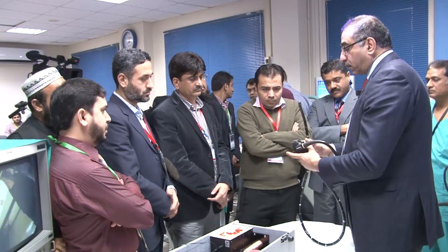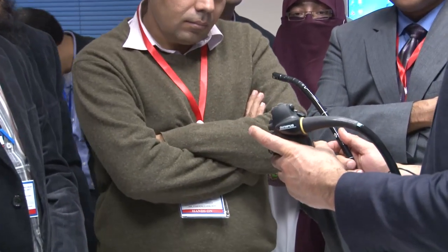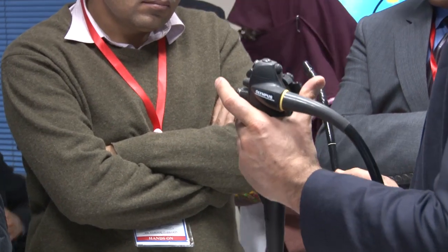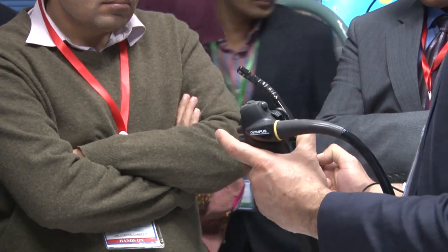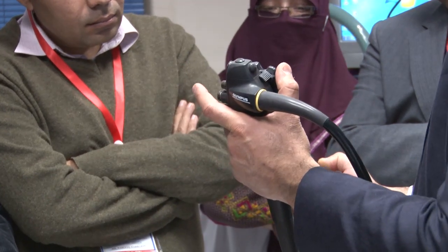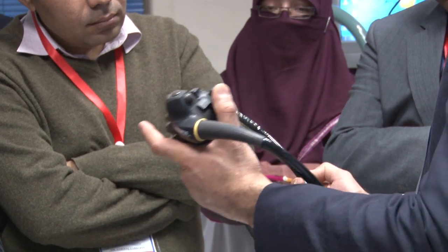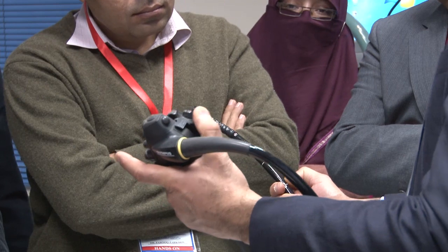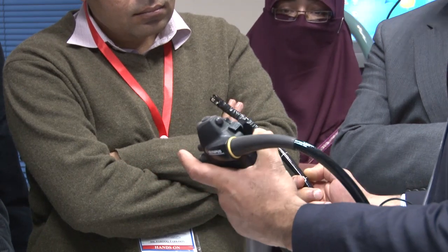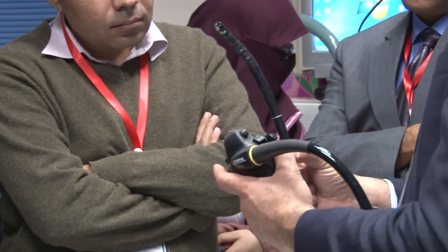That's the big wheel and the small wheel. Big wheel is for up and down movements, and the small wheel is for right and left deflection, right? Okay. So the standard terms we use, up and down: when you say up, it means putting the tip of the scope up, which means pulling the wheel down. When you pull that down, the tip will go up, right? And again, it is the dial left or dial right.